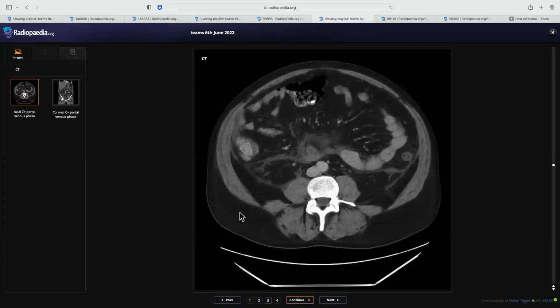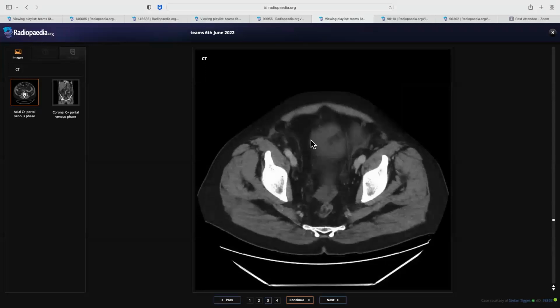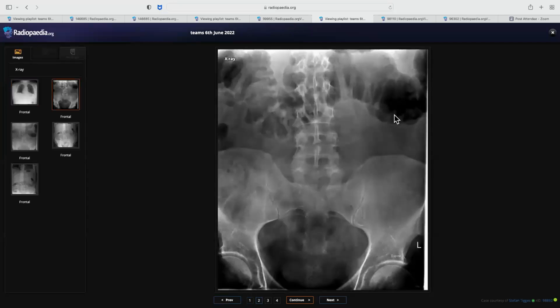Okay, time is over. So very well done, Dr. Ankur. Especially in picking up this colon cutoff sign, it was really nice. You just picked up instantly. That is what this case was mainly for, because if you don't pick that up, then it will not move forward. They will not go to the CT if you don't pick up this colon cutoff sign. It's very classical. You don't see any gas in the distal descending colon and beyond this.